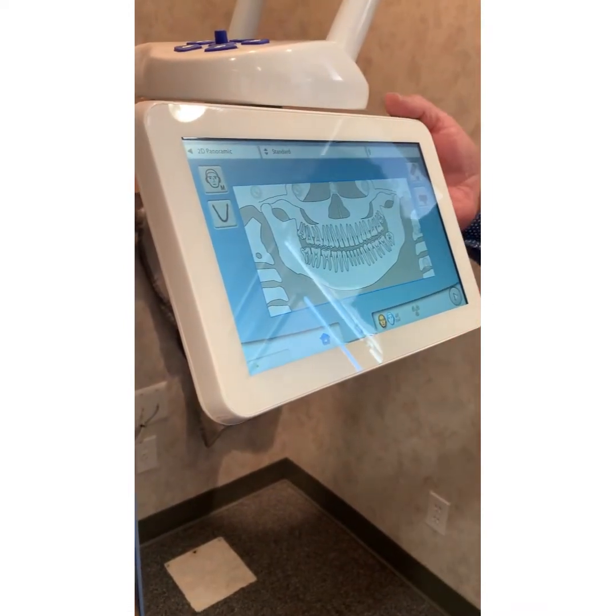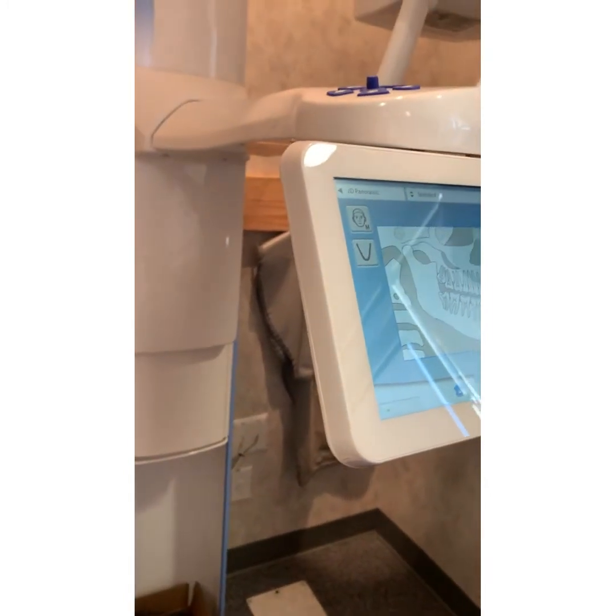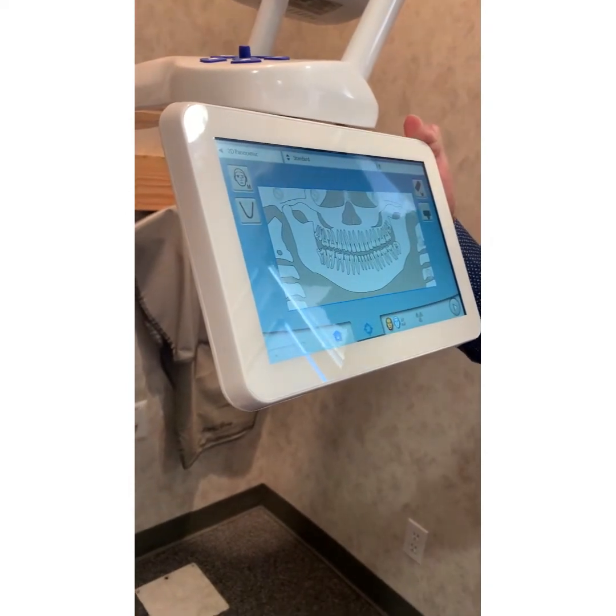But I think that's a really underused tool that we offer. When I come back in 3 weeks and we do a quick review, which is what I normally do, I'll say, so how's this working? And you guys say, oh, I forgot that was even there. Sometimes it just kind of goes past.